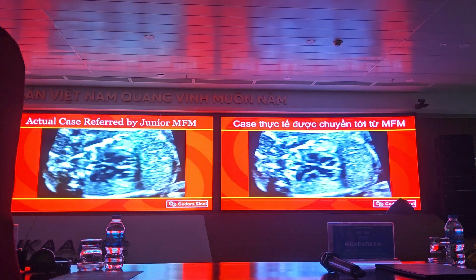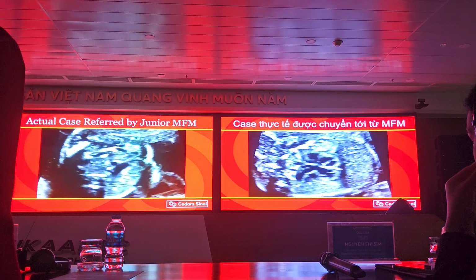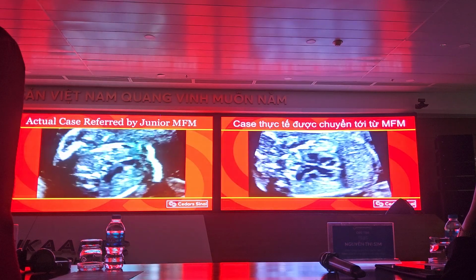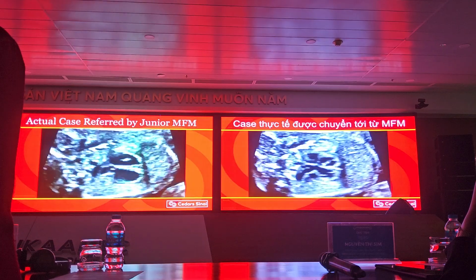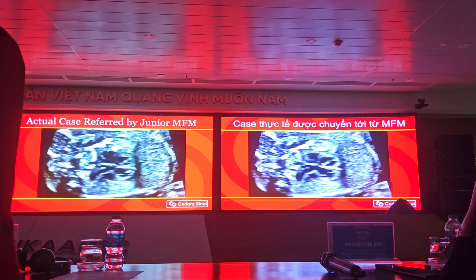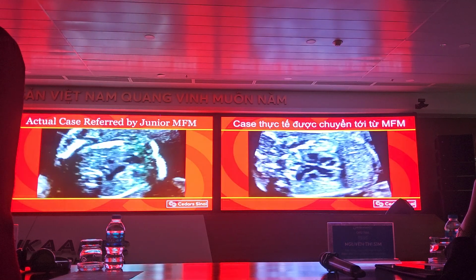This is from a maternal fetal medicine doctor who was a junior attending, whom I had asked, like all the attendings, to send me clips when they weren't sure if it was normal or not, and they just sent them on my iPhone. And she sent me this clip and said she wasn't sure if it was normal or not. And if you're looking at it, she did a nice sweep. I'm able to see that this is a case of transposition pretty easily because it's a sweep. If it was just one image through the 4-chamber, another through the LVOT, another through the RVOT, it's not nearly as helpful as showing the sweep.